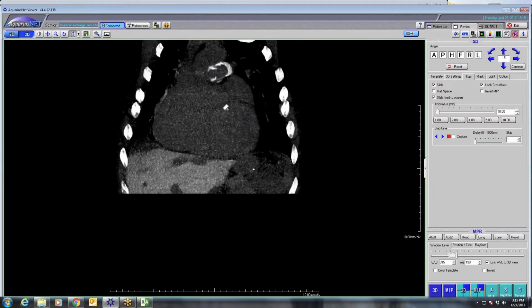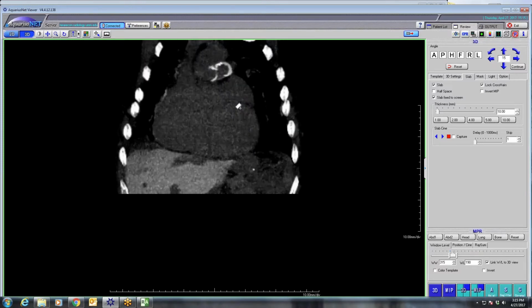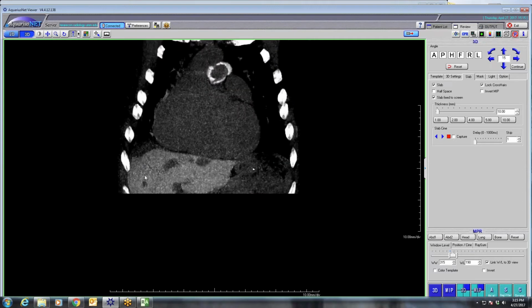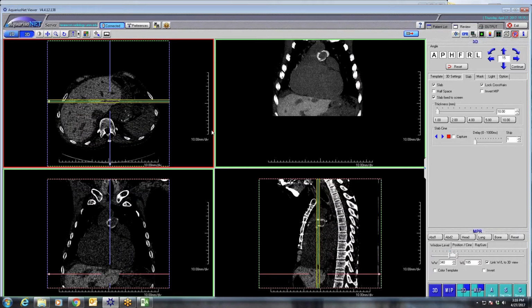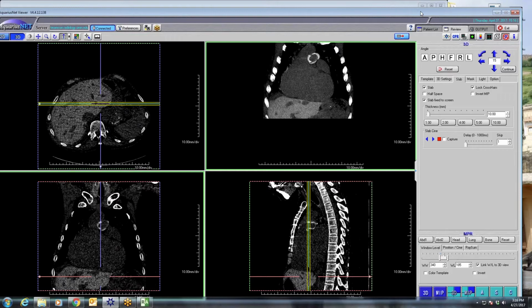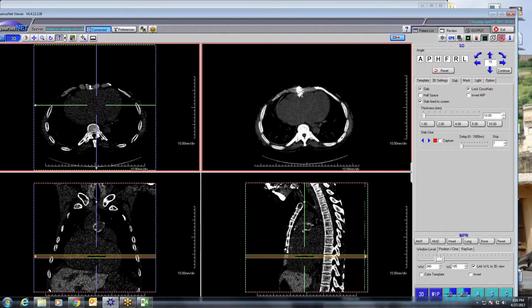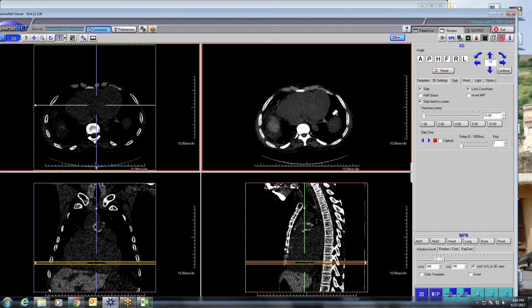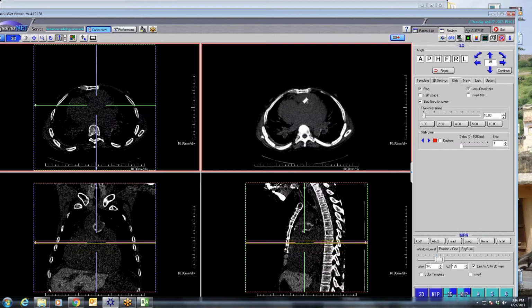This was a guy with Williams syndrome who was on a very, very high dose of amiodarone for his congenital heart disease with pulmonary artery augmentation and arrhythmias. So the least exciting case, but a nice classic example of it. Unfortunately, he didn't really have any classic stuff in the lungs, although we were debating whether some of the consolidation he had in his right middle lobe and lingula was a little high density, but we'll just leave that for the imagination.